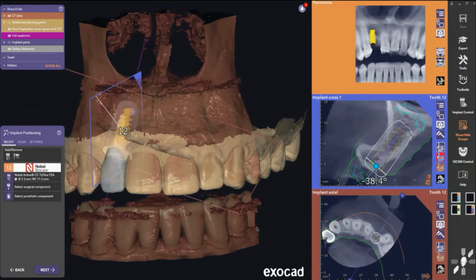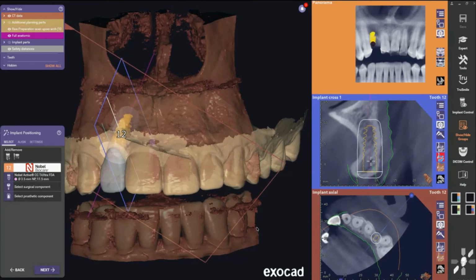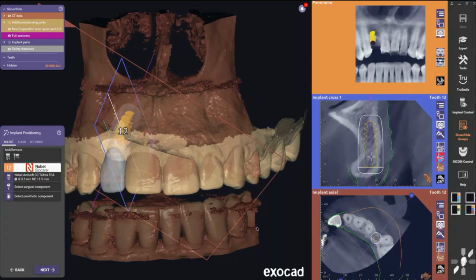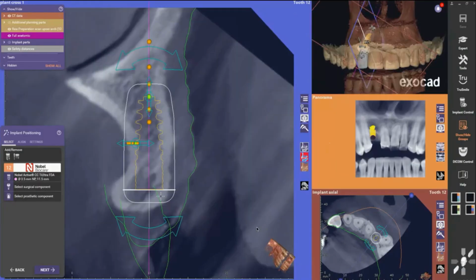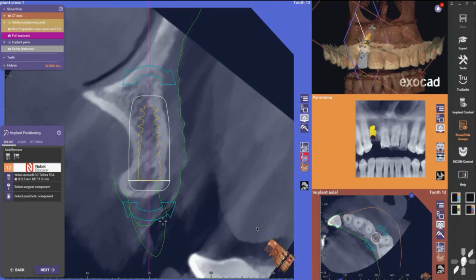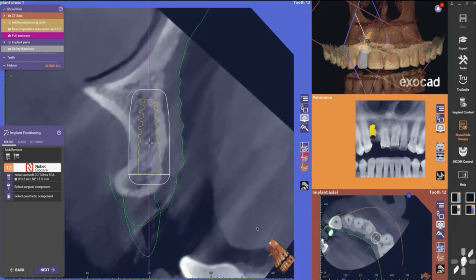And then we start working on the reslice curves that you see on the right. And again, just like you would do on various x-rays with overlays and in your implant training, this way it's the same. It's the same dimensions. It's the same STL, in fact, of the final implants. And then we identify the position, make sure that we're restoratively driven, right?